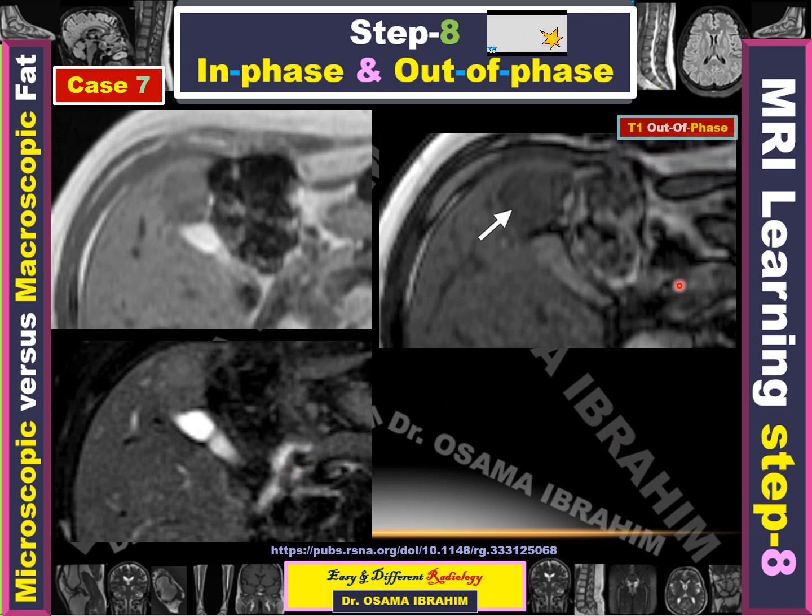Yes, there is out of phase here. There are boundaries separating water from fat according to the physics of the gradient echo, which takes time to make these signs to recognize the opposed phase, and there are lesions here.